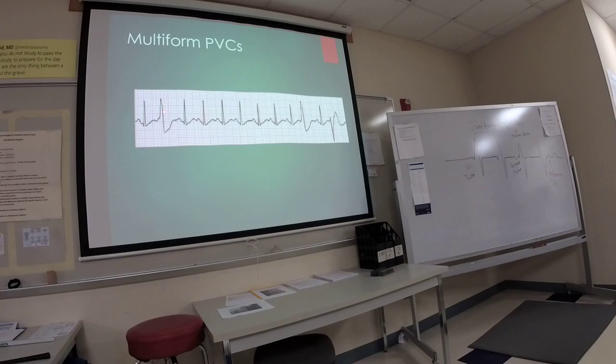Okay, these are marginal. But these are multifocal PVCs. It just means that they're from different points in the ventricle. Remember that those ventricle cells can fire independently. When they do, they create a multifocal. Underlying rhythm is what? Sinus. Correct. Okay.